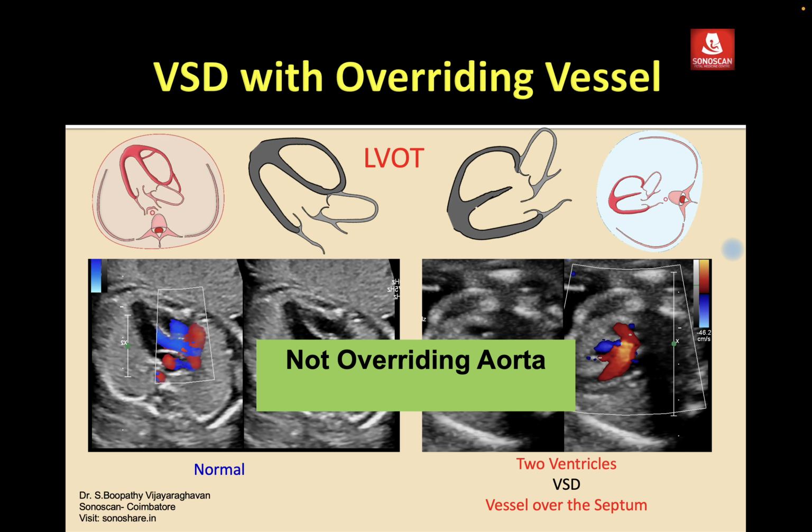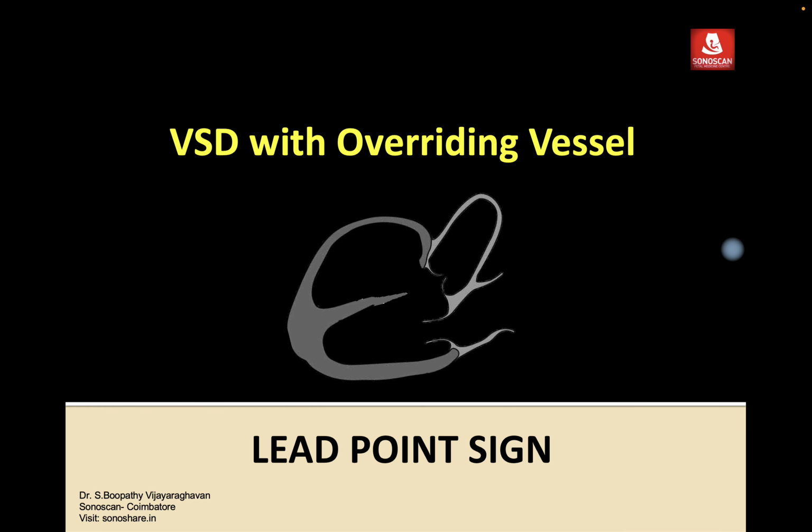It is not overriding aorta as conventionally described. It is actually overriding vessel. Why I use this terminology is explained in the lecture.